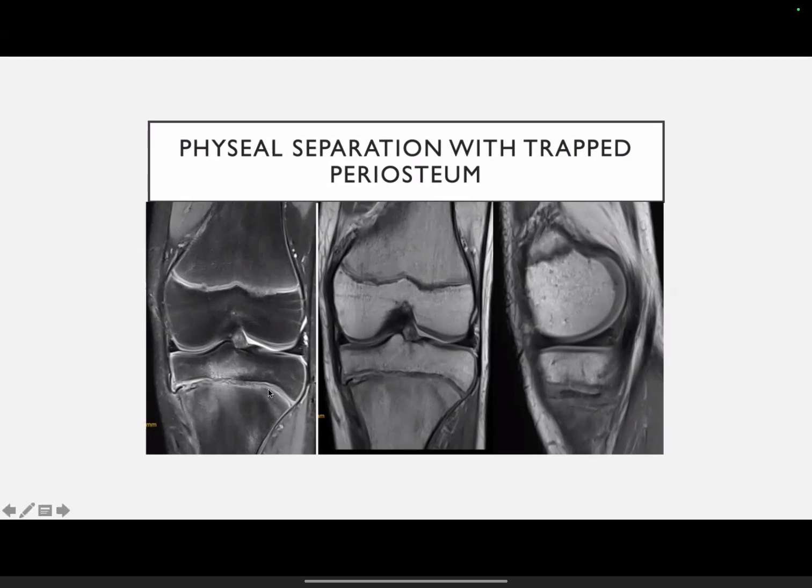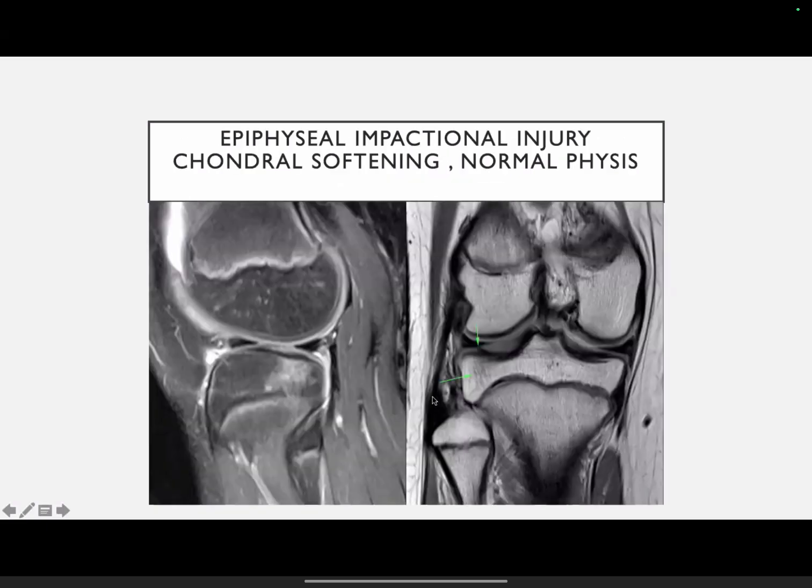So see how beautifully we have come from a physiological to a pathological condition, right from the periphyseal focal zones to the puberty spurt to a physeal separation in a Salter-Harris type injury.